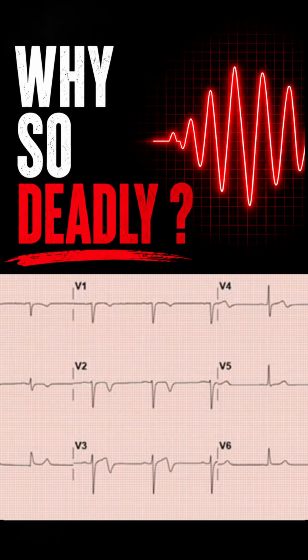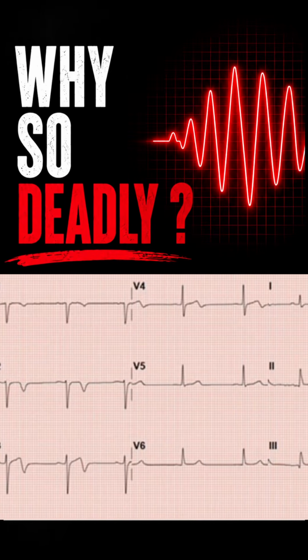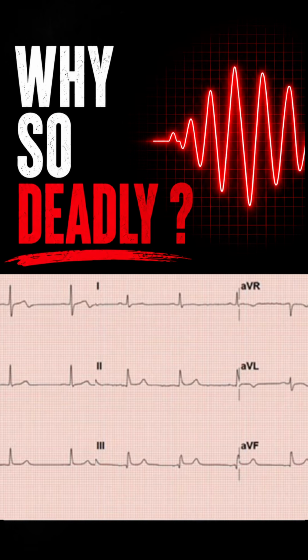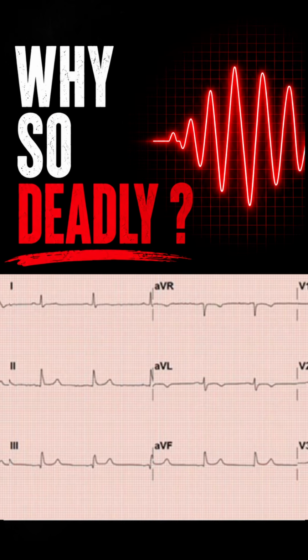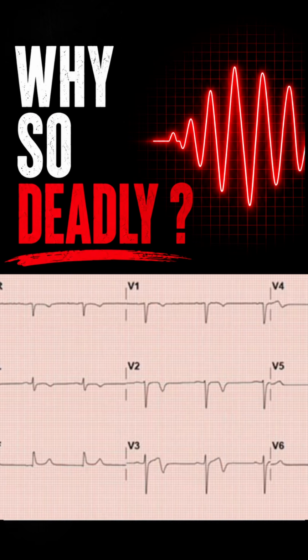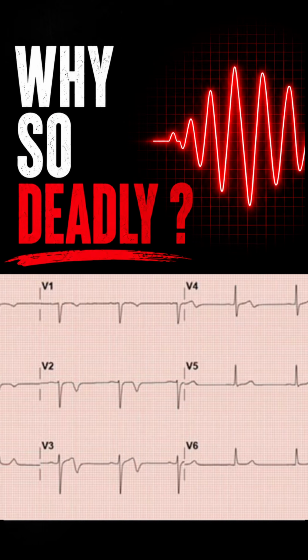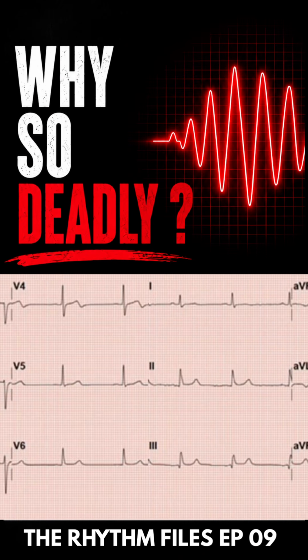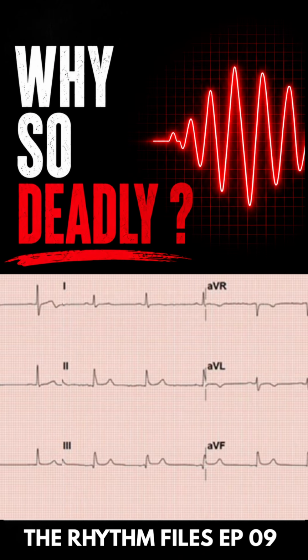So the ECG that you're seeing here is of a person who is apparently asymptomatic. There are no cardinal symptoms of any cardiovascular disease. And if observed casually, this ECG also seems okay. But wait, look at the T waves in the V2 and V3 leads. They seem out of the ordinary. They are not what a physiological T wave should look like.